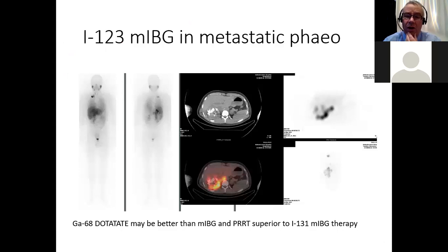Now, I showed you one of an MIBG in the SPECT-CT tumour section. And the thing is, these tumours tend to be either malignant or endocrine. So where you put them, it doesn't really matter. But this is an MIBG study showing uptake around a liver metastasis. They've actually tried to embolize it, but not very well, as you can see. There's the embolization coil, and here is the living metastatic pheochromocytoma that the coils have all missed.